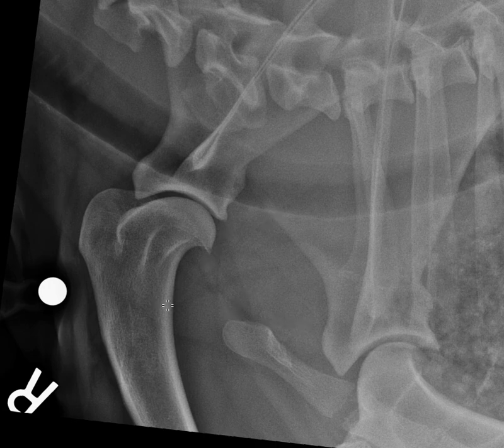When I look at the lateral view in particular, I see a sharply margined area of new bone formation on the caudal aspect of the humeral head, and also some remodeling on the caudal aspect of the glenoid, and a little bit here at the neck of the scapula. These findings we've talked about before as periarticular new bone formation, which can be a combination of osteophyte and enthesiophyte surrounding a joint. This is a non-aggressive finding of degenerative joint disease, and in particular in the shoulder, is very frequent in dogs.